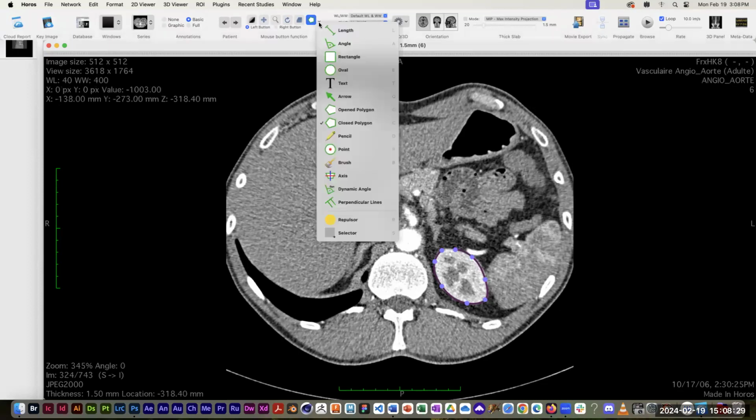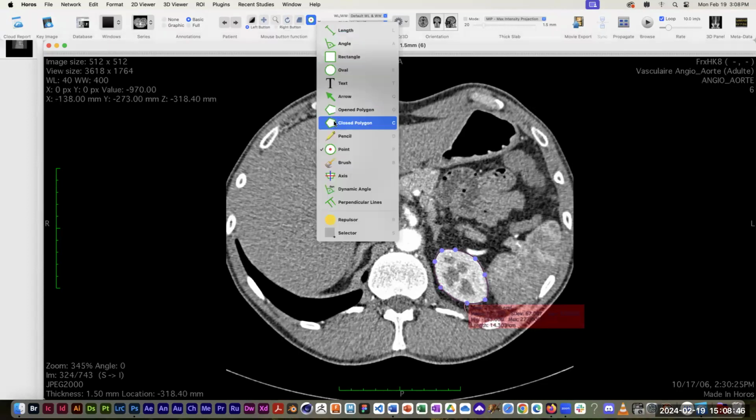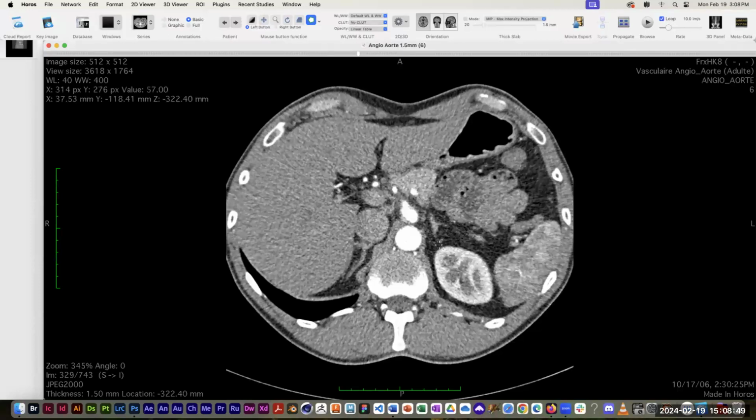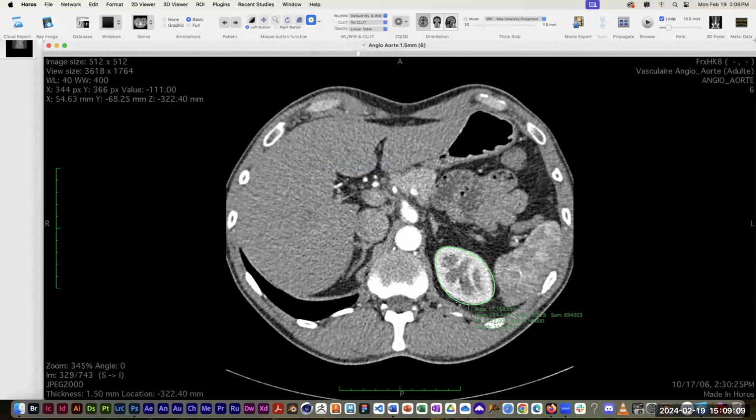So there is another tool in here. There's a point tool you can click on, and that will let you grab a point and move it around. Since you don't have a ton of control over where the curves are, you kind of want to go back to, whoops, okay, see, don't do that. Sometimes you do have to tweak them a little bit because they don't go right where you want them to.